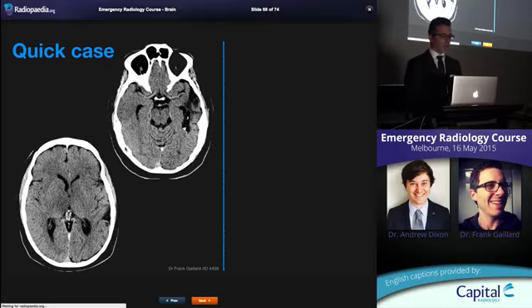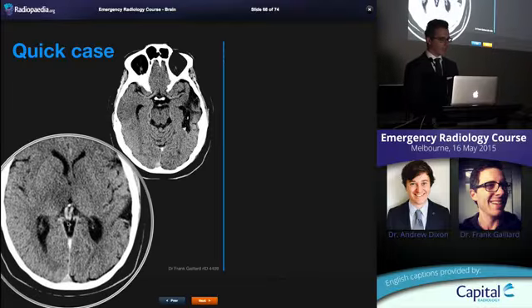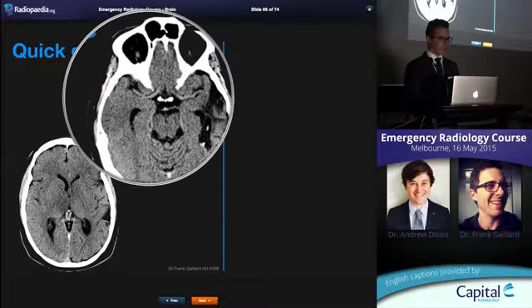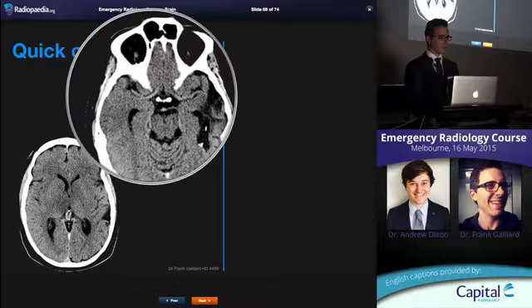Another cause of bilateral thalamic central infarction or hemorrhage is outflow problems. So top of basilar is blood not getting into it, or you can thrombose the internal cerebral veins here. See how hyperdense they are? And here, compared to some other vessel. So you've got internal references.